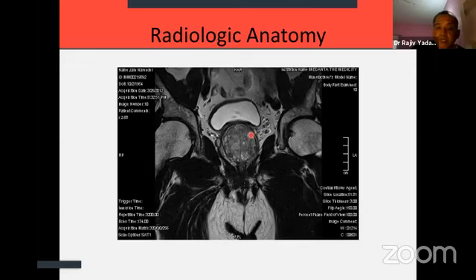Similarly, if there's an asymmetric tumor on one side and infiltrating this area, you can look at the interface between the levator ani and the tumor on one side compared to the other side. So in imaging, it is very important: you can always compare with the other side. If the disease is not symmetrically involving, you can always have a comparison with the other side. And you can make out in those situations whether a patient should undergo surgery or not, based upon the chances of involvement of the sphincteric complex.